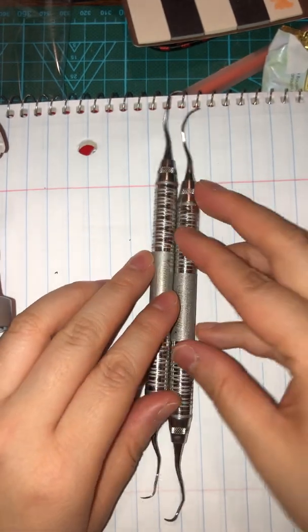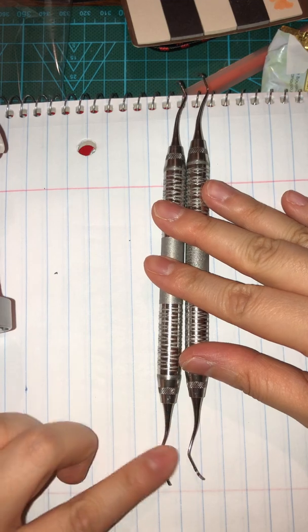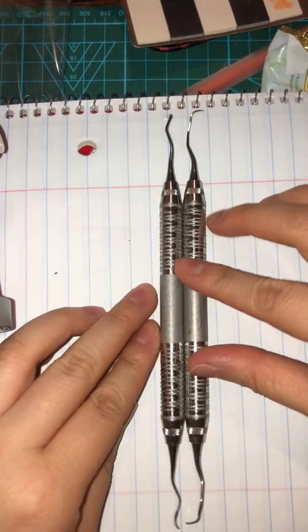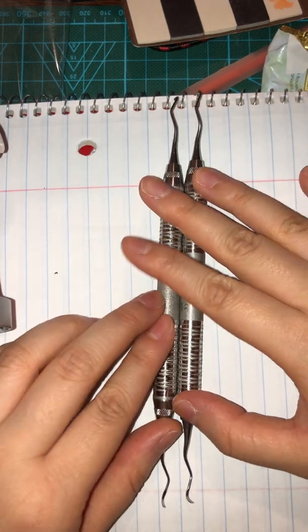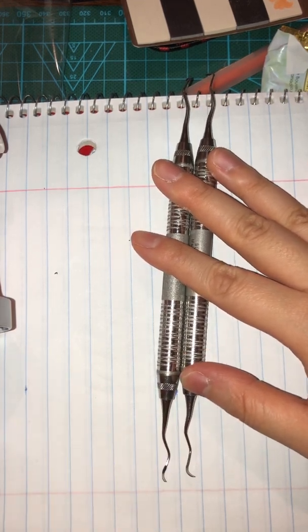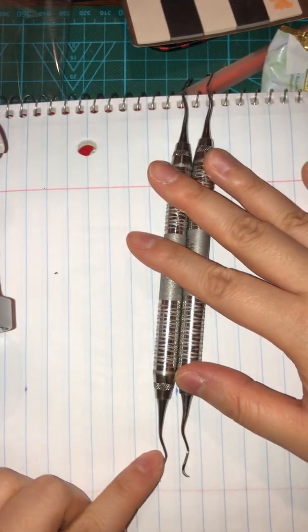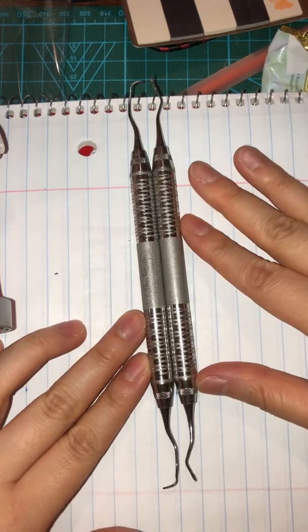So whichever working end you're looking at, you should be able to tell which side is lower and try to adopt that working end and visualize what surfaces you will put in your teeth. And then by knowing the mesial and the distal side, you should be able to tell the instruments.